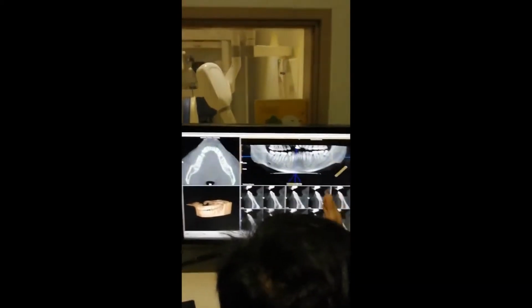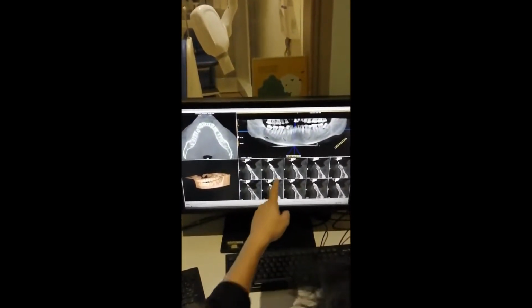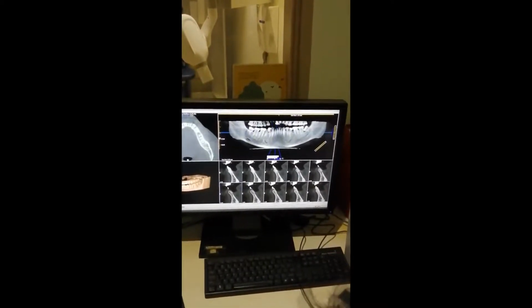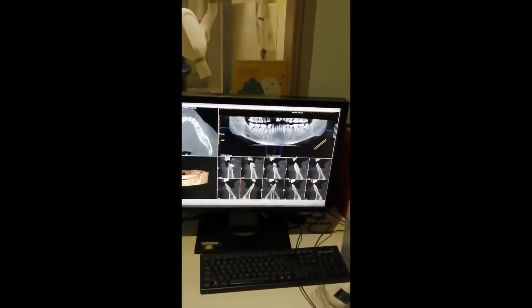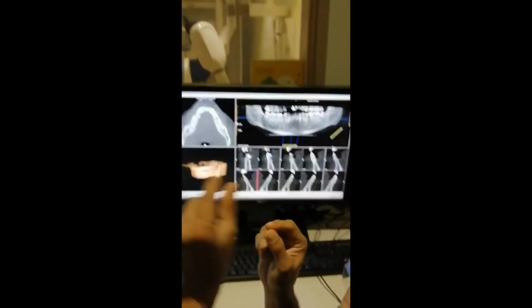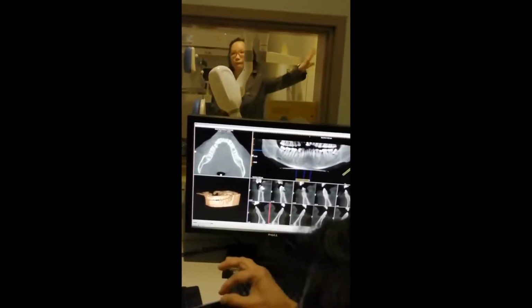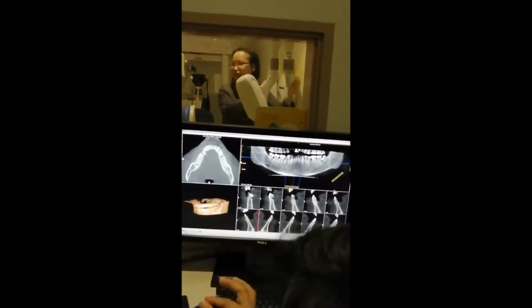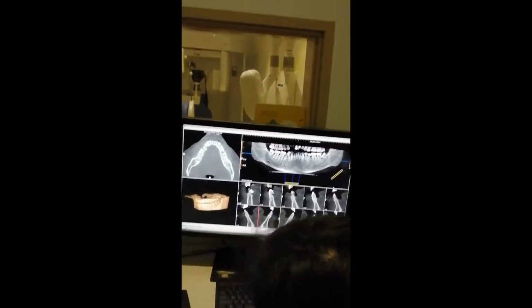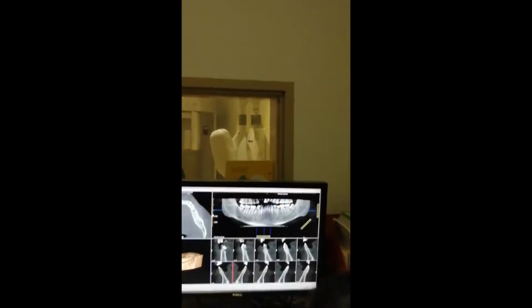That means, see, whenever I move my cursor, it is moving, right? If I keep it at 2 or 3 millimeter, from one point to another point, it will jump through 3 millimeter. See, if this is my mandible and I want to check here, I break it open and check, right? That breaking open and checking can be done in 3 millimeter intervals. In between, I can't see.